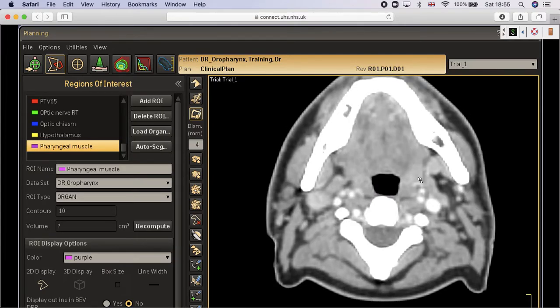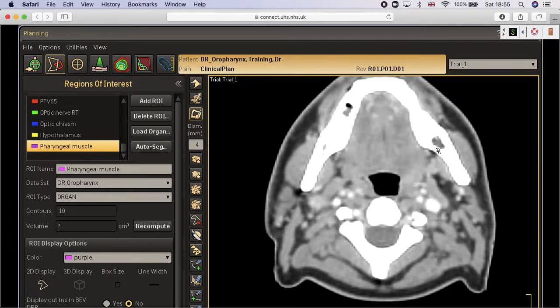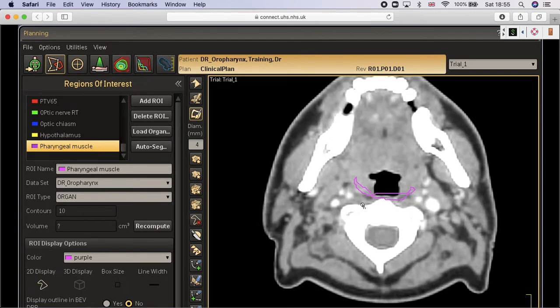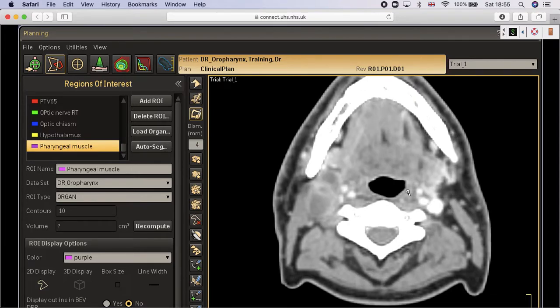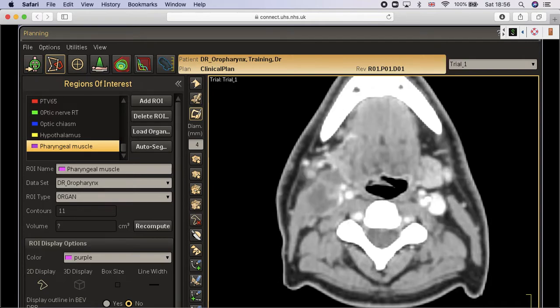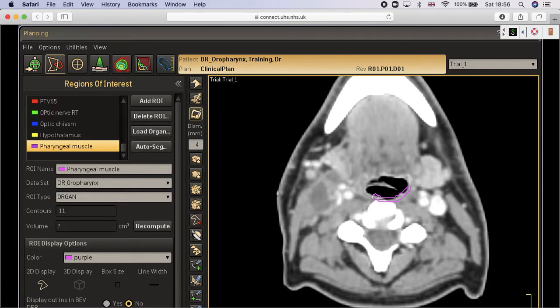And then you continue drawing this plate shape. Okay, you don't have to go down, because we said the mandible end completed, there is no mandible anymore, so it's just plate shape, until you reach the level of the tongue on either side of the tongue. So this will be again pharyngeal muscles. Okay, I hope it's not too bad. Yeah, you go down, and you can see here, in front of the tongue, either side is the tongue, because it has an attachment on the tongue. We all know that. So it's like a plate shape.